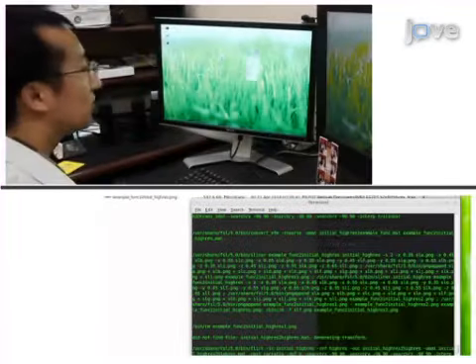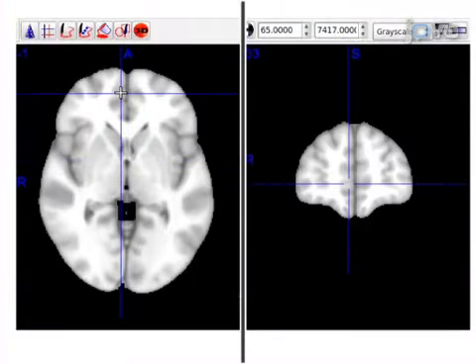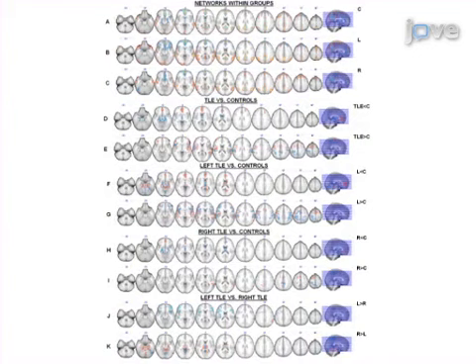As a second step, the fMRI is pre-processed, which prepares the data to be statistically analyzed. Next, the pre-processed fMRI data is analyzed in order to obtain statistically valid comparisons between the two groups. Results are obtained that show differences in brain networks among patients with epilepsy compared to brain networks of healthy control subjects, based on statistical differences in brain network maps between these two groups.